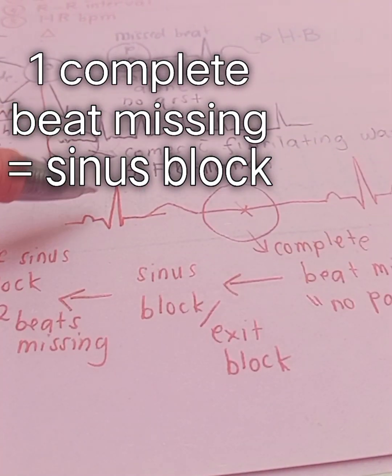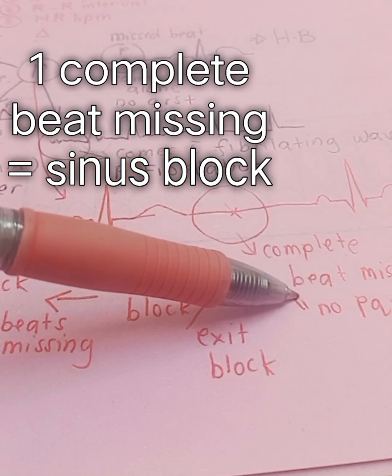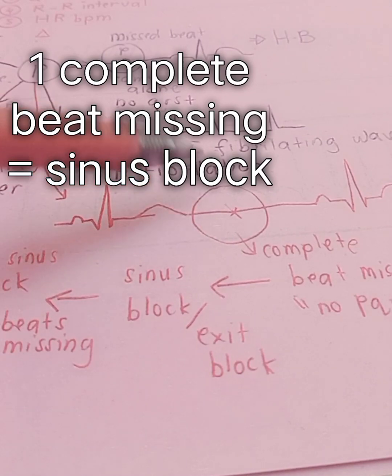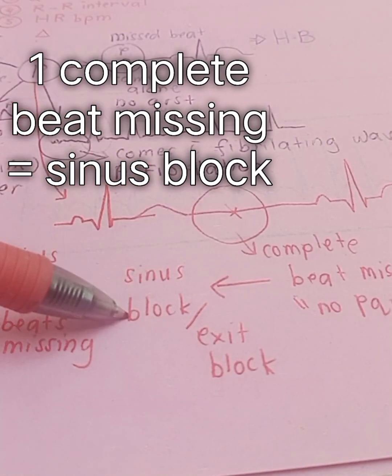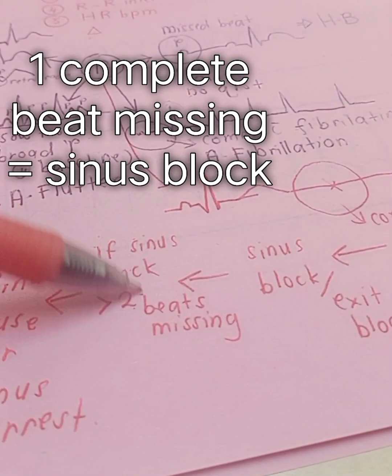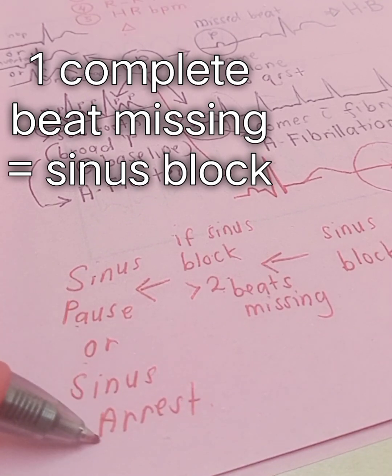If we find in the rhythm there is a complete beat missing, no PQRST, that means one beat missing. One beat missing is a sinus block. If sinus block has more than 2 beats missing, it means sinus pause or sinus arrest.